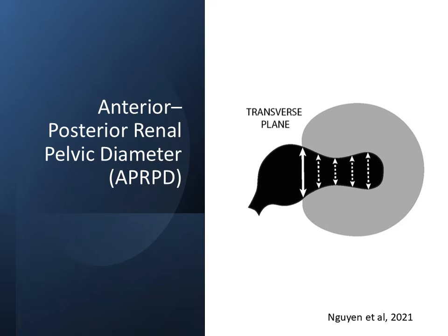In postnatal studies, the intrarenal and extrarenal pelvis should be readily distinguishable. In antenatal studies, in contrast, the intrarenal and extrarenal pelvis might not be distinguishable. Therefore, it is acceptable in antenatal studies to report the largest renal pelvis diameter, even if it is extrarenal.